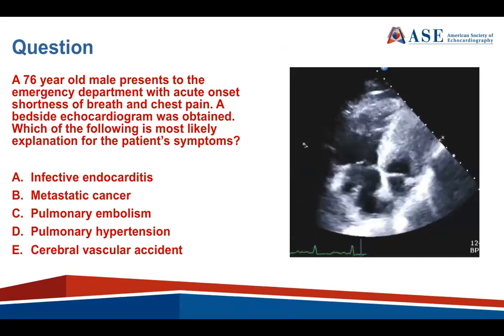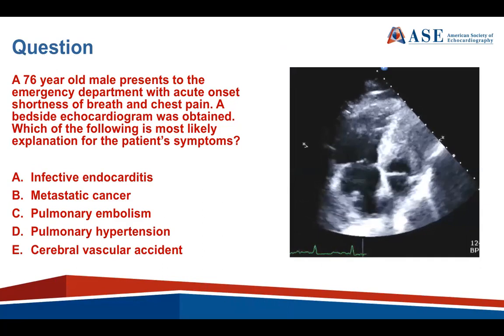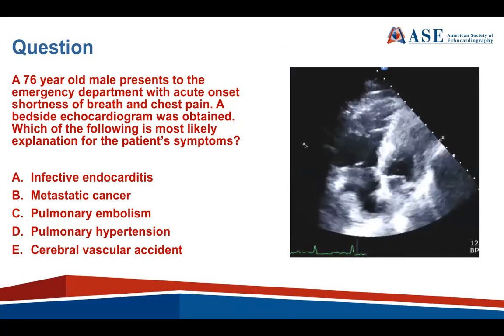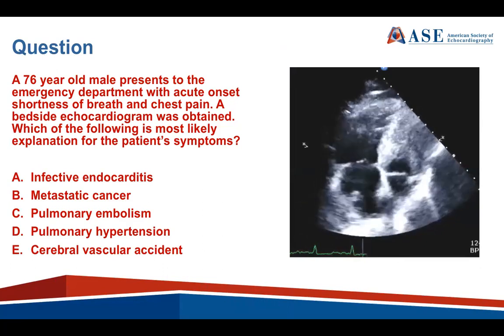Okay, we'll go to another question now. This is a 76-year-old male who presents to the emergency room with acute onset shortness of breath and chest pain. A bedside echocardiogram was obtained. Which of the following is the most likely explanation for the patient's symptoms?